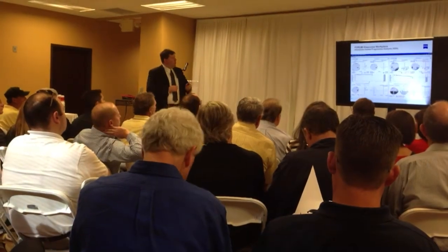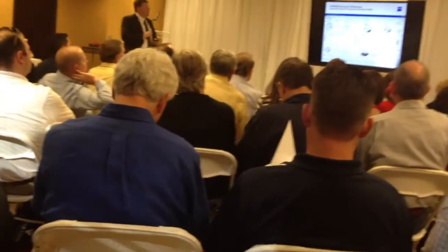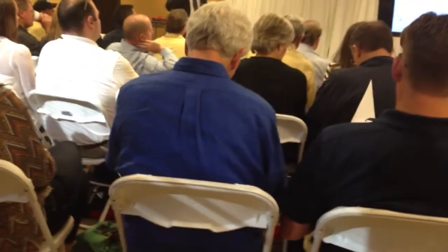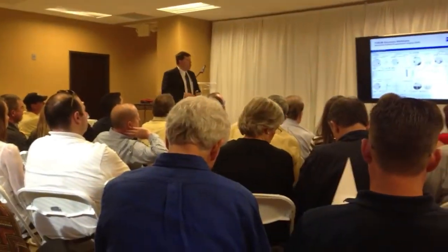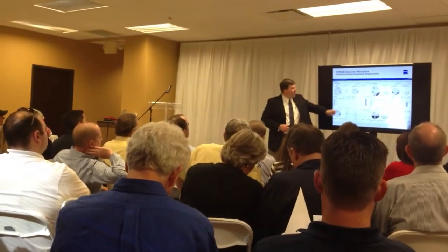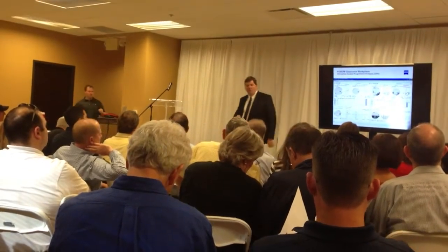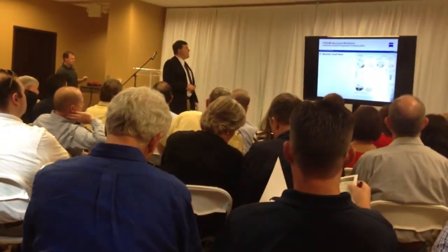And the workplace is on the bottom. Again, you can look at specific fields. If you click on them individually, you can actually change the appearance. And actually, just by hovering over each one of these little boxes, it will change the visual field, so you can see that down below. It's really quite a sophisticated thing.